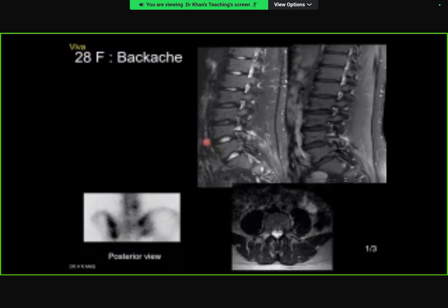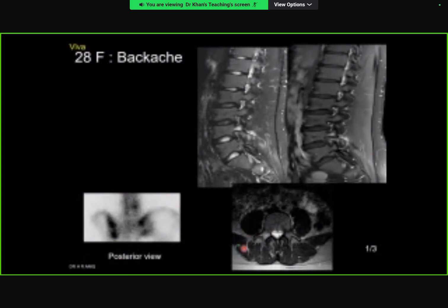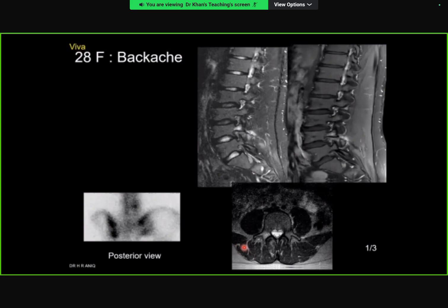Okay, so on the selected sagittal MRI slices, there's high STIR signal in the pedicle of L4, which I think on the axial correlates to the right pedicle, sorry. And also some increased T1 signal. There's selective uptake in that pedicle on the bone scan. In a patient of this age with a history of back pain, these appearances would be in keeping with an osteoid osteoma. What is your differential diagnosis?